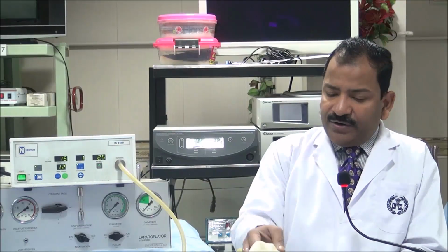Now, when you attach the cannula, suppose this is the cannula, and I will attach the cannula. After attaching the cannula, you cannot work with the 1 liter per minute. Why are we using 1 liter per minute with the Veress needle? Here embolism should not occur.